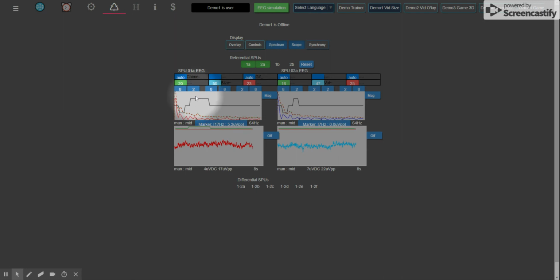So let's look at that. This number here in the middle, in blue, is the analog. This row here of numbers is the 3 analog control signals. These up here that flash on and off are the 3 digital control signals. Reward in green, inhibit in red. When they flash, it's saying that the digital reward or the digital inhibit is active. There, reward just generated. Inhibit just generated.